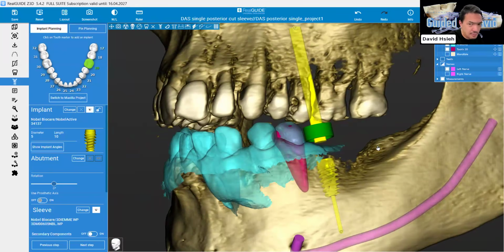If that happens, we spend all this time trying to design a guide. Compared to a regular drill, the guided drill has a guided portion, right? So the guided drill is usually longer than a traditional drill. Imagine a longer guided drill attached to your handpiece, and your handpiece takes some vertical space as well. And then you have the patient with a limited opening, right? When the patient opens their mouth, it doesn't open straight up and down. It's like a hinge like this, right?